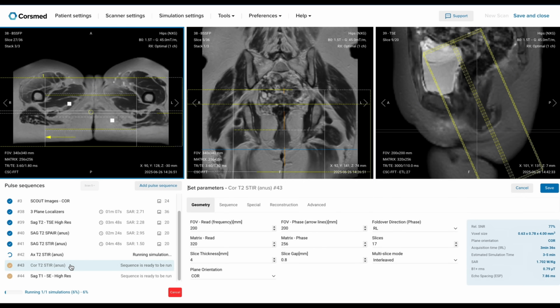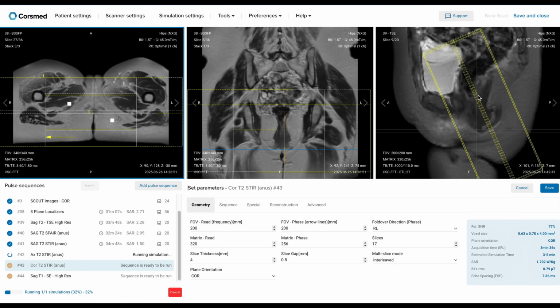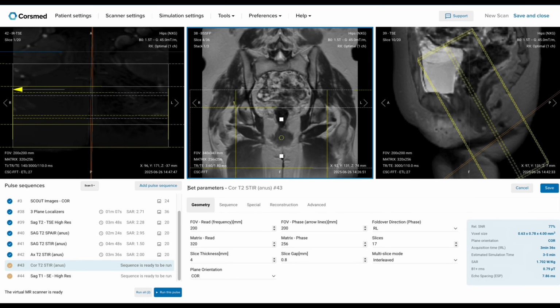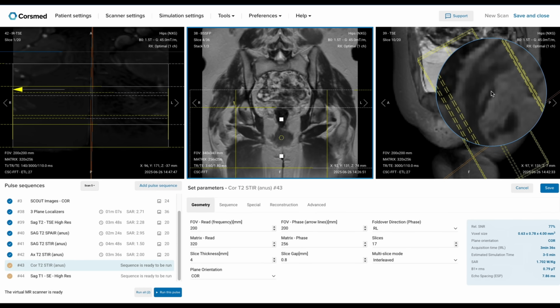Next, we have the coronal sequence, which we will angle parallel to the anal canal. As you can see here, this is the anal canal. So I'll grab my package and go as straight as possible, parallel to the canal. I'll straighten here and make sure I also cover the horseshoe tracts and bilateral spread. I want to cover this area and this area behind the rectum as well.